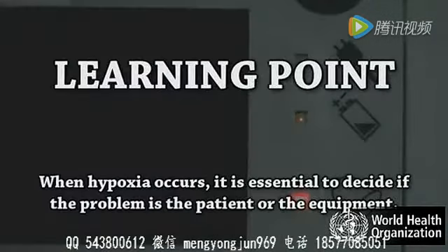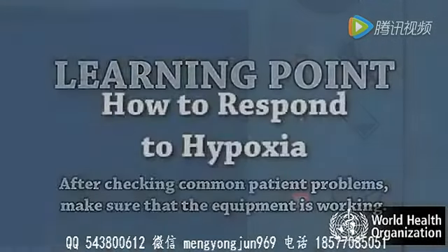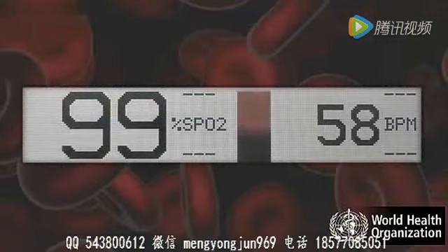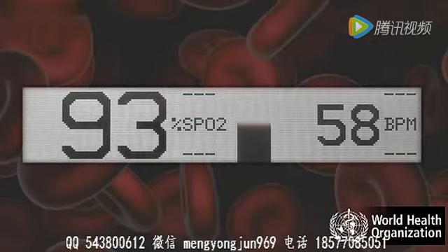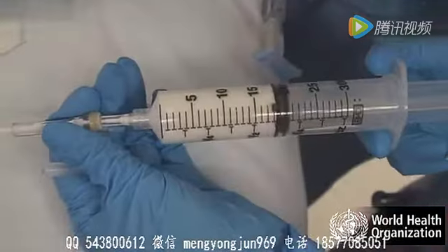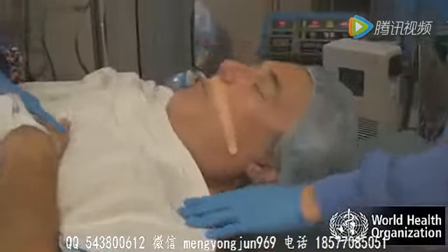Learning point. When hypoxia occurs, it is essential to decide whether the problem is with the patient or the equipment. After a quick check of these common patient problems, make sure the equipment is working. How to respond to hypoxia. During anesthesia, low oxygen saturations must be treated immediately and appropriately. The patient may become hypoxic at any time during induction, maintenance, or emergence from anesthesia.